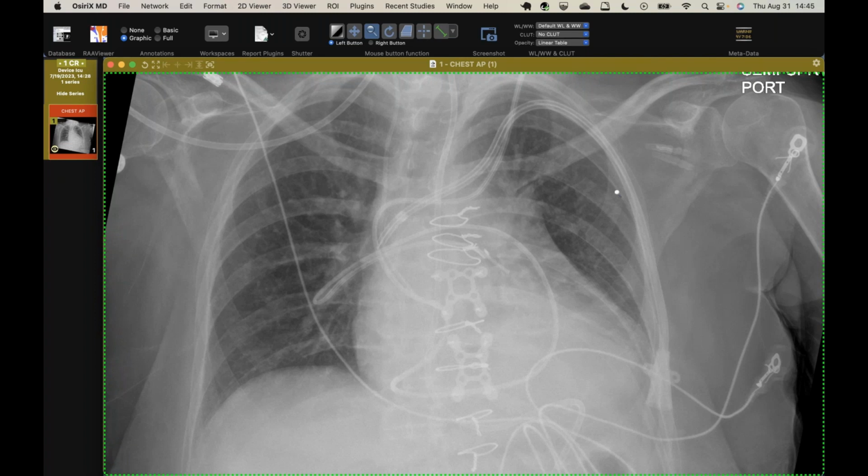So, presumably, in order to get these loops like this, the catheter doesn't go out into that interlobar right pulmonary artery and then turn around abruptly, make a hairpin turn, and come back. That would be physically impossible. What happened is that as you were feeding it, it snagged where you see the tip, and then they pushed. That's hard to push on these catheters, but they may have had a really strong intern. So from the snagging point, it formed a loop, and as it pushed, the loop went out. So the loop was threaded out into that interlobar pulmonary artery.